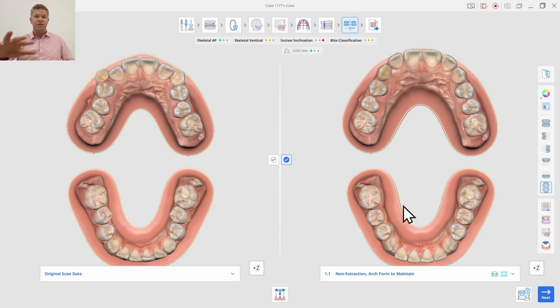While the doctor goes in, I'd recommend, if you do not have a cephalometric x-ray, to put it in what's called the double occlusal view. The good part about this is sometimes the software has a difficult time identifying the center axis of the tooth. So this is a very safe way for the patient to look at the mouth, start self-diagnosing themselves, while not having to worry about some tooth having a weird shape or being positioned incorrectly. And it allows the doctor to come in and view this and talk through with the patient if there are any concerns like that where the AI misdiagnosed a certain tooth. So if you do not have a cephalometric x-ray, we recommend this view.